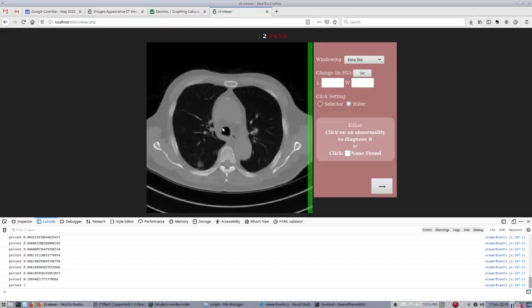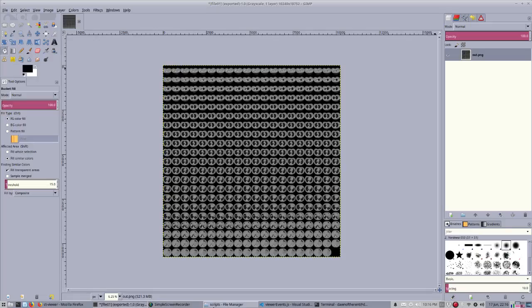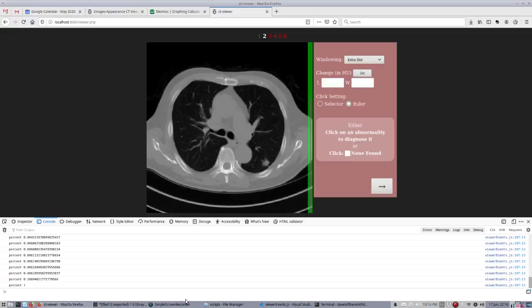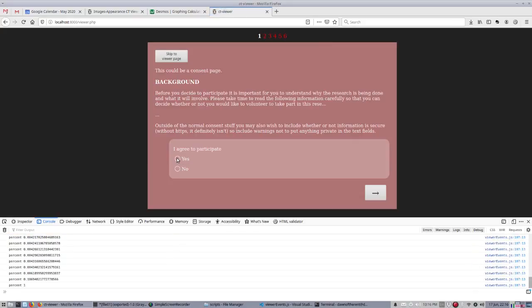And again, I don't recommend you do much of any of this because normally people won't see it. They'll be doing the demographics form and the consent form and all that stuff while the viewer loads, and hopefully it'll all be loaded by the time they actually get to it. And that's it.